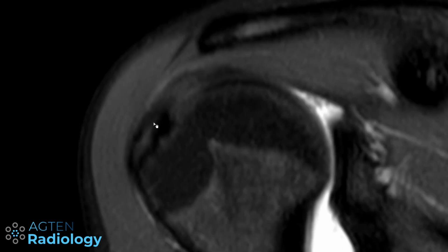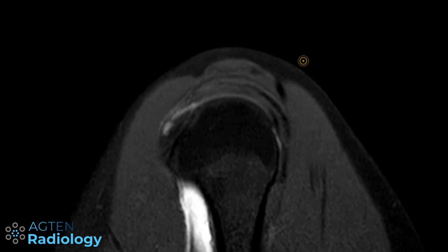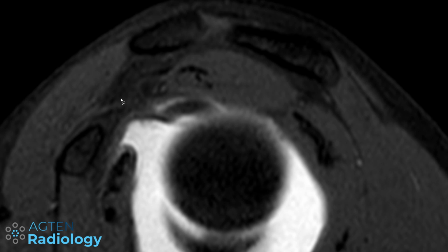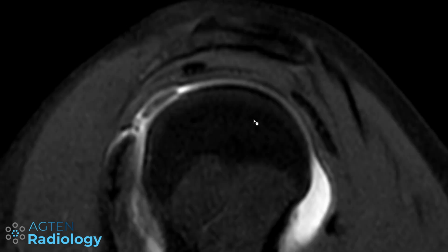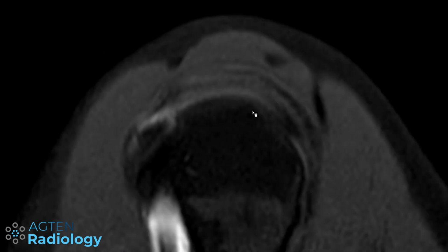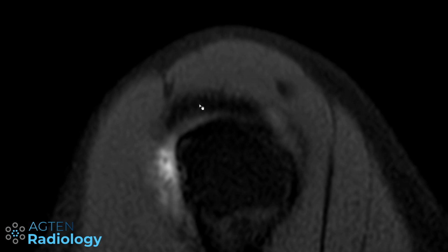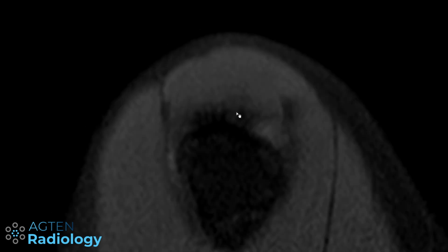Now the question is, what is that? And therefore I urge you to always have a look also at your sagittals, and we can do that right here. So this is anteriorly, this is posteriorly, supraspinatus, infraspinatus, and now we scroll from the joint to the lateral aspect, and we can appreciate the supraspinatus tendon and the slightly differently oriented infraspinatus fibers. This one is still supraspinatus, and the infraspinatus will now overlap this portion here up to this point, probably here.